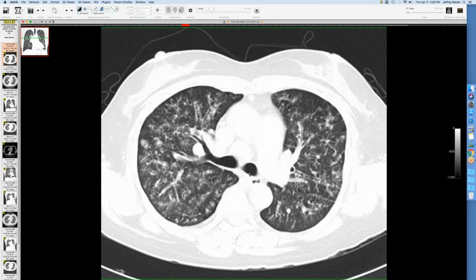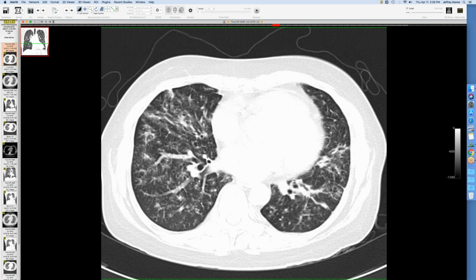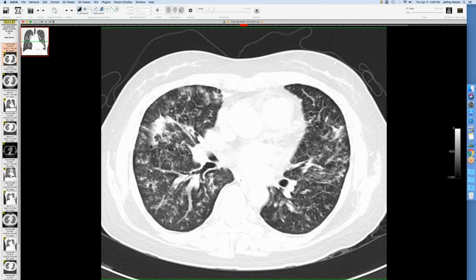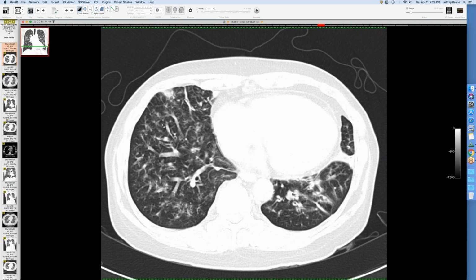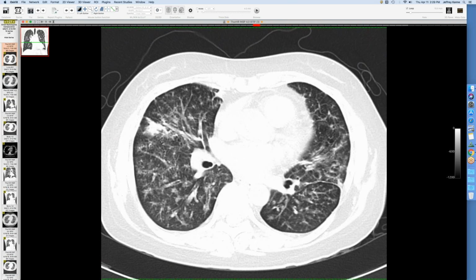How about follicular bronchiolitis? That's the kind of lymphocyte infiltration. Right, I agree, and I think it's sort of a spectrum. To me, that's more localized lymphoid hyperplasia around the small airways, and if it expands into the interstitium of the lung, it's called LIP. But histologically, what I've been told and what I've read is LIP causes quite extensive expansion of the pulmonary interstitium and almost distorts it with so many lymphocytes. So it makes sense you would not just see little nodules and cysts, but you should actually see some denser opacities, whether something like this or more confluent ground glass.